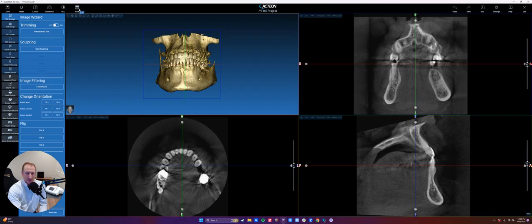The ruler button is very important for CBCT. One of the greatest advantages of CT is its true measurements. So when we click on the ruler drop down, we have distance, angle, annotation, ROI, bone density, find measurements, and clear all measurements. If we start with the simplest and the one we're going to use the most often, it's distance. Clicking on any 2 places in one panel will give you an exact distance all the way to 0.1 millimeter. So let's say we want to measure from the center of this canine to the center of this canine. And we can click and hold on to the measurement and move it out of the way if it's in our way of viewing, but it can give you all the way to the 10th of a millimeter.